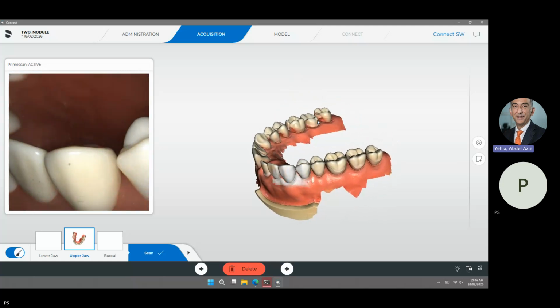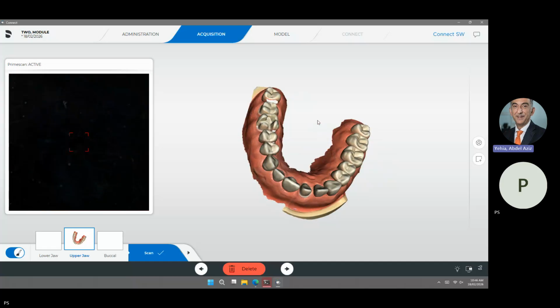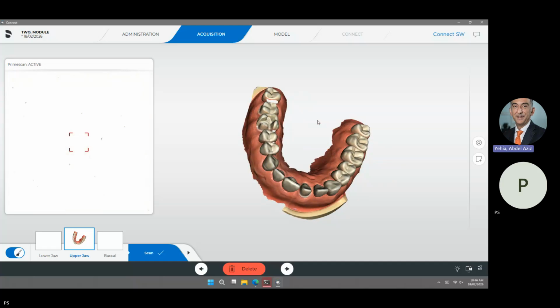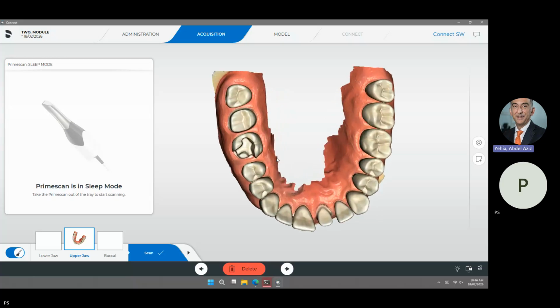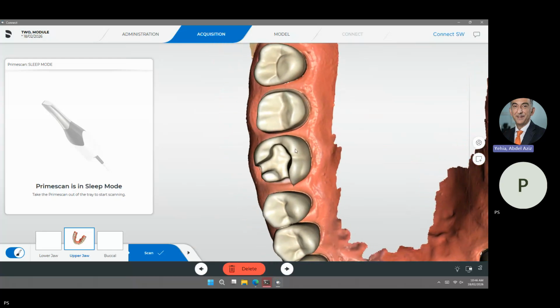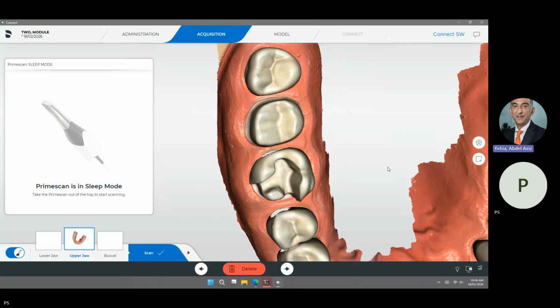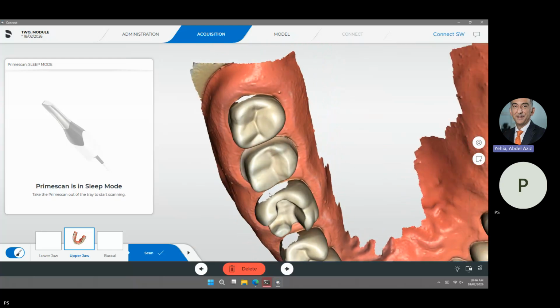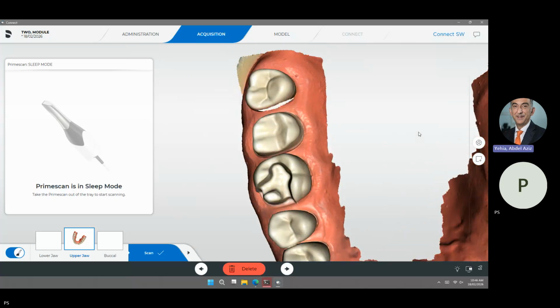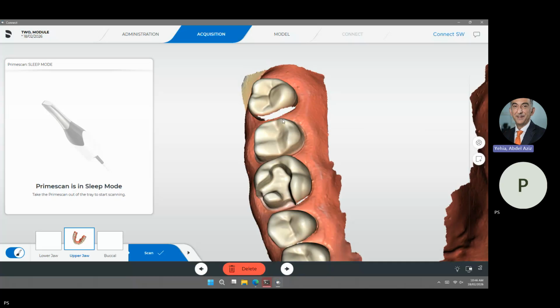Okay, important is to select the right angle of doing this. But the question again here is, where is my focus area? Or let's say, where is the area where I must not have any gaps? And this area is the crown, of course. It's this crown we're working on. So I cannot have any gaps in this prepared tooth. I cannot have any gaps in the adjacent proximal contacts, from one side and the other side. These I need to fill.